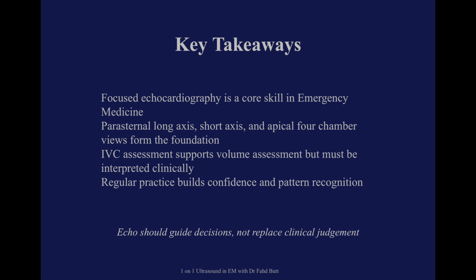So in the end, just to recap, the focused echocardiography is a core skill in emergency medicine. Parasternal long axis, short axis, and apical 4-chamber views form the foundation. The IVC assessment supports the volume assessment but must be interpreted clinically, and the regular practice builds confidence and pattern recognition.